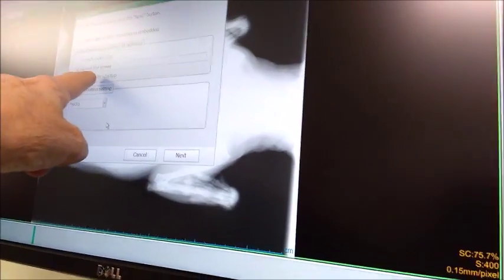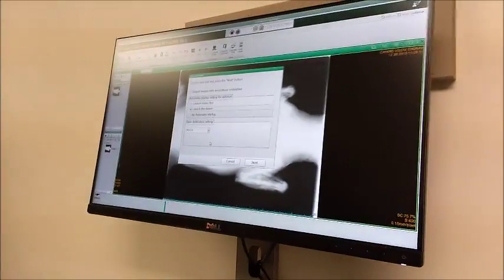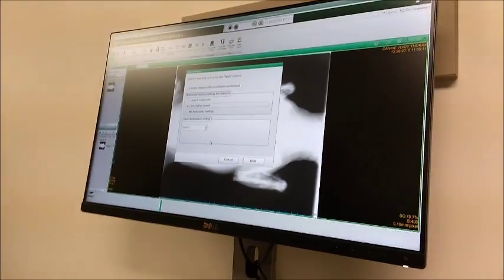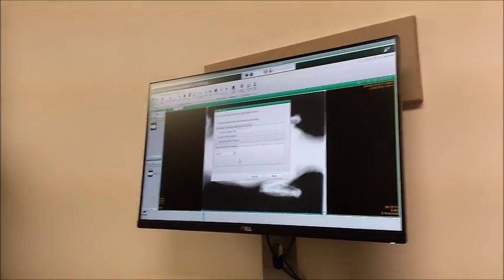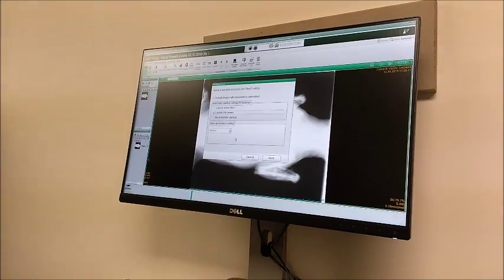It's better to say launch the viewer. Launch index HTM, there should have been an index there. We didn't get anything. I may not have even given it enough time. I think maybe launch the viewer would be good. You can just try it. Now this is to put the image on the disk? Yeah, so you would put the disk in, this comes up, and then you hit launch the viewer.